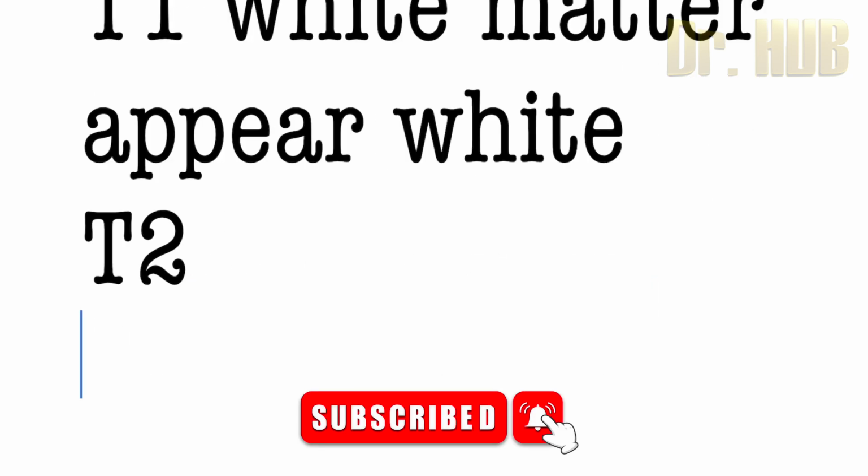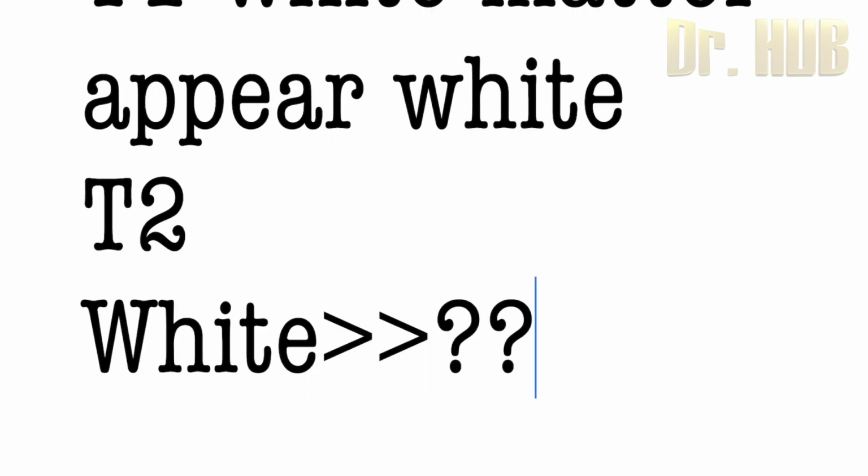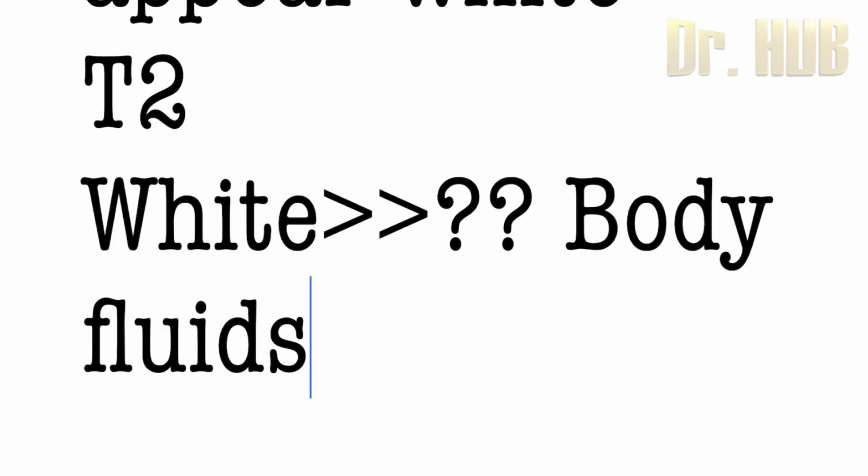Now moving on to T2 weighted MRI, here the body fluids appear white. So what appears white? It will be the body fluids.